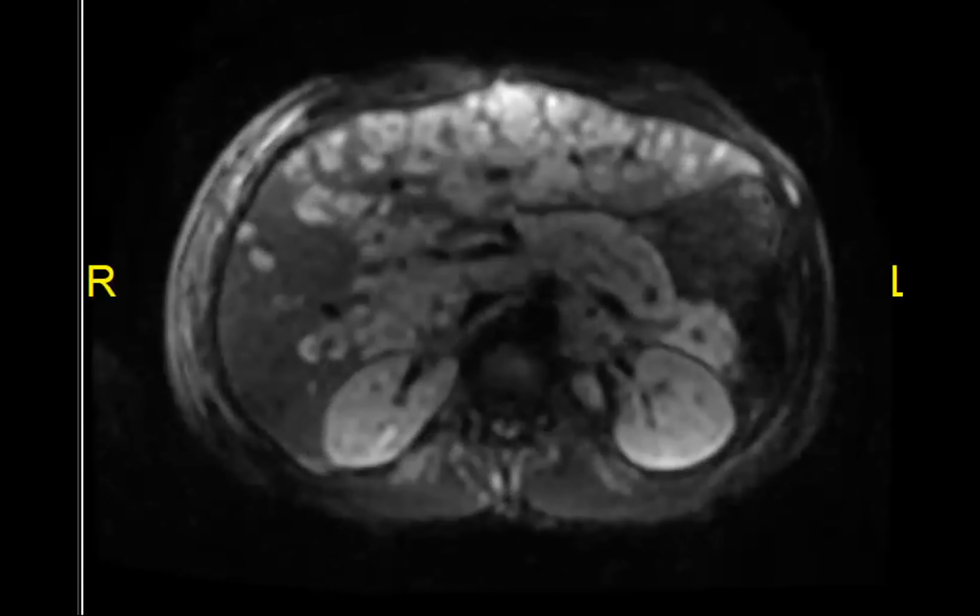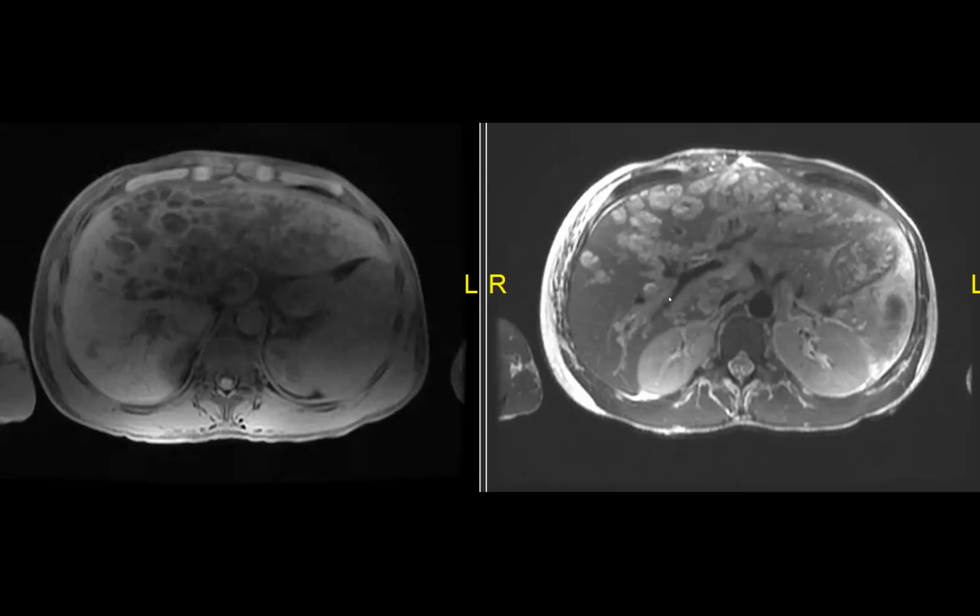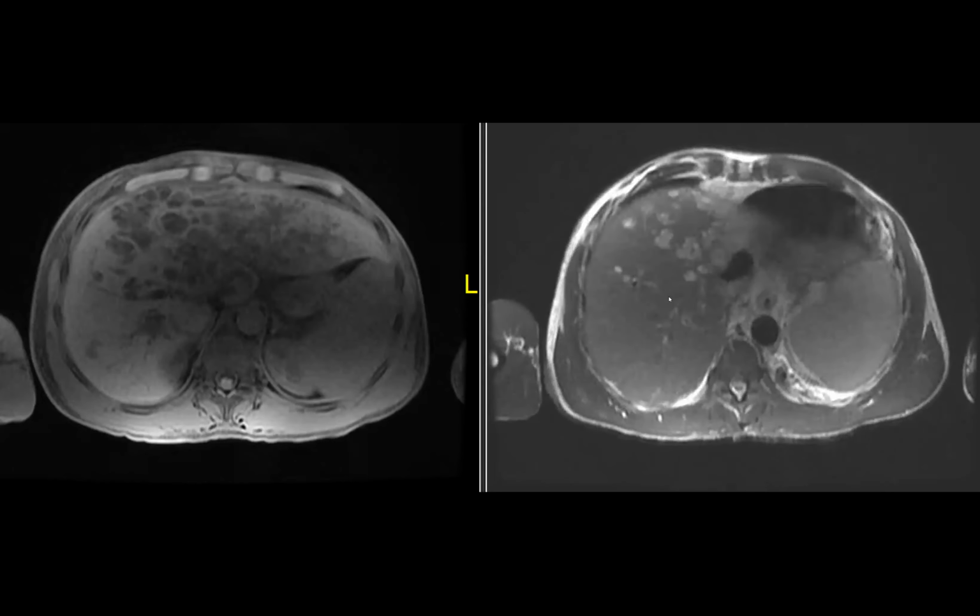So you can see just these extensive T2 hyperintense areas, but you can see that they're sort of following the... We only see the diffusion. Triad, right? Oh, maybe you're only showing us the diffusion. You should be seeing two, no? No, now we see two. Oh, I'm so sorry. I didn't realize that it won't show across the two monitors.